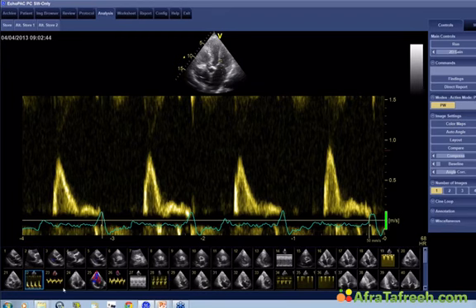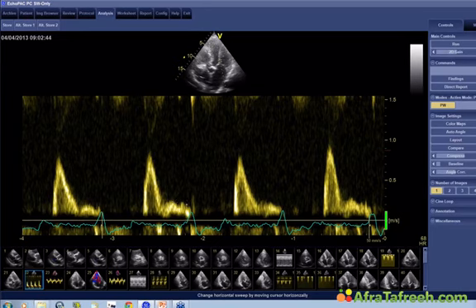So it's clear that the patient has diastolic dysfunction, severe diastolic dysfunction, and severely elevated left ventricular filling pressures. How does that play out in this specific case? Well, it shows us that the patient must have symptoms. It means that the left atrial pressure is high, and these left atrial pressures translate into the pulmonary circulation, and that is what basically causes pulmonary edema and signs of heart failure. So I truly believe that the patient has symptoms. This is the proof of it.